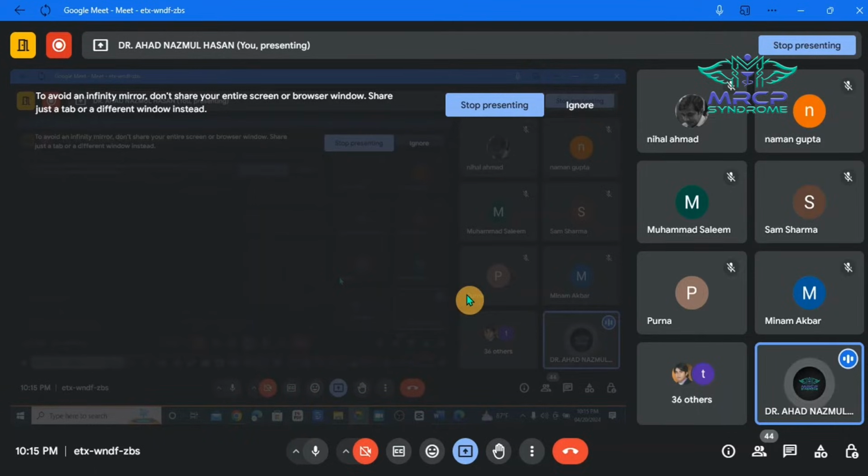So can anyone tell me the limitations of MRI? Some of the limitations: it takes a long time to do MRI, and the patient is supposed to lie still. Yeah, very good. If the patient is not clinically oriented, then it's difficult. MRI requires a prolonged acquisition time for the production of images. So MRI is not suitable in the acute emergency condition, and this is one of the biggest limitations of MRI.